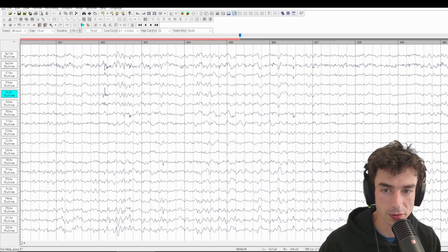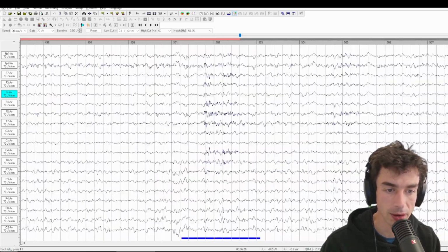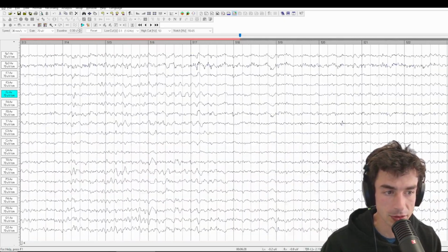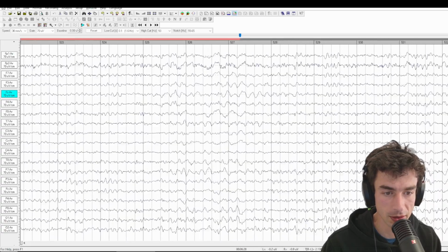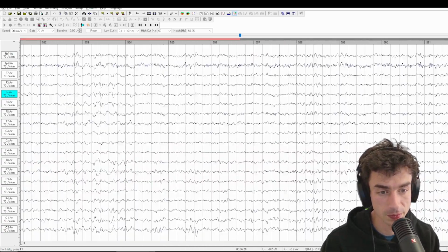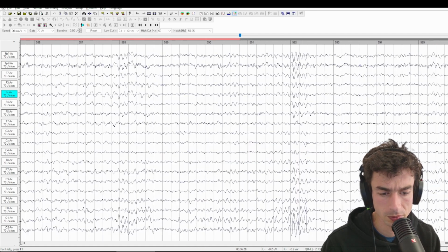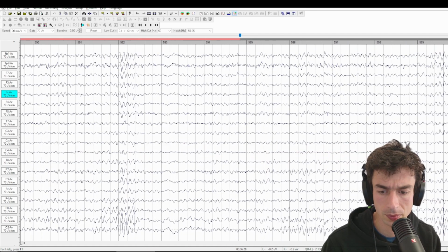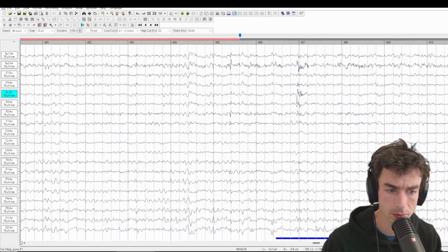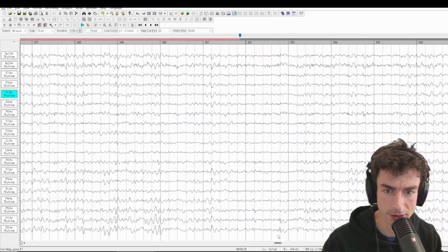And we've gotten quite a few little snippets, little fragments so far. It'd be interesting to find another one that has that beta spindle in it. And I believe that was earlier on. We may have just run past it.